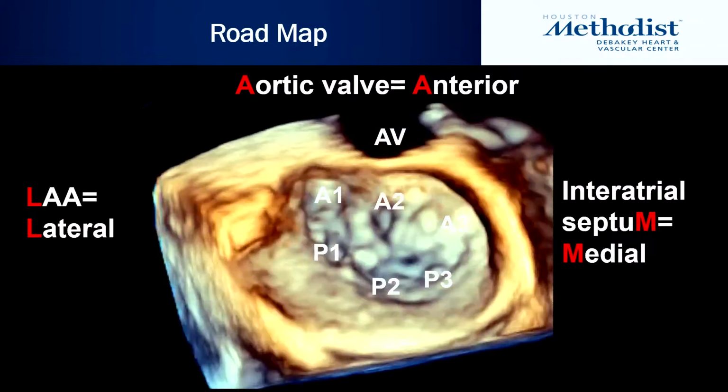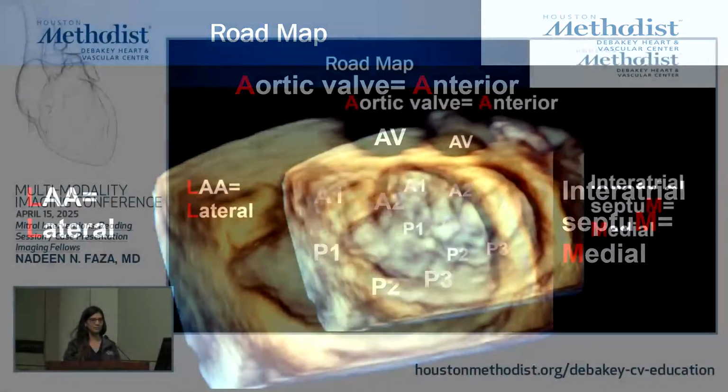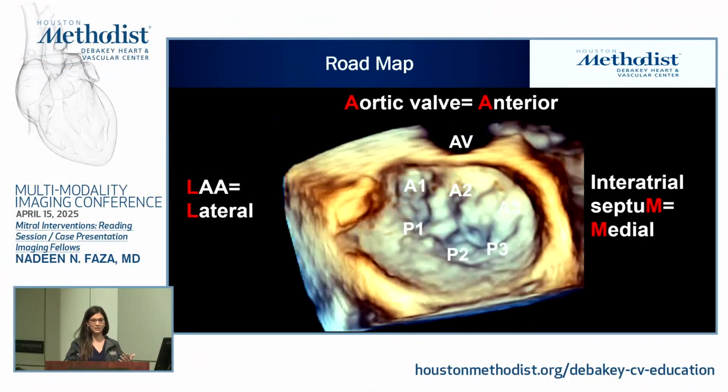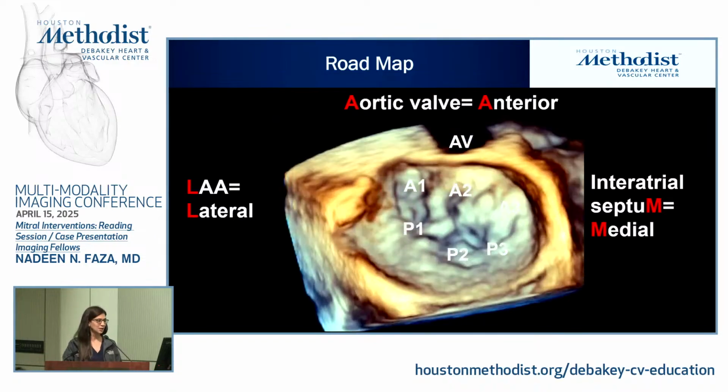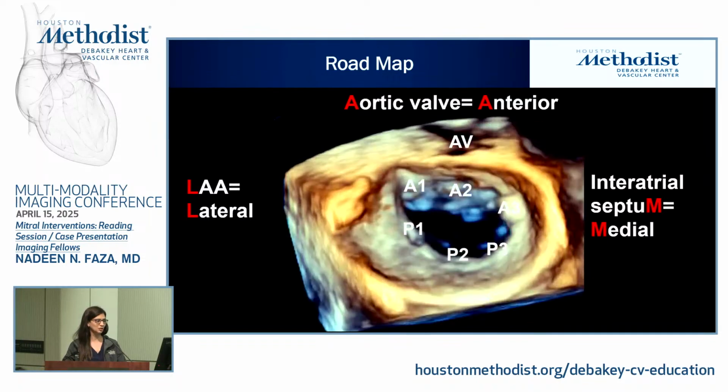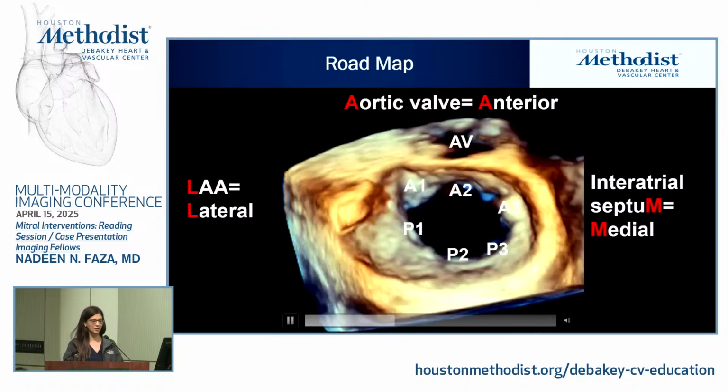And like Dr. Tang showed very nicely, we heavily rely on the 3D surgeon's view of the mitral valve to facilitate communication in the cath lab. So we're talking to the interventional team in a unified manner. And this is your 3D surgical view where your aortic valve is marking your anterior border, your atrial appendage is marking your lateral border, so you see a Watchman device here to help you, and your septum is that medial border. And the scallops closest to the medial side are A3, P3, and those closer to the lateral side are A1, P1.